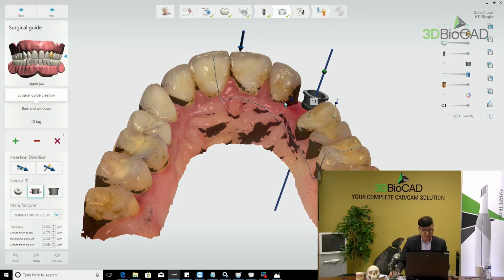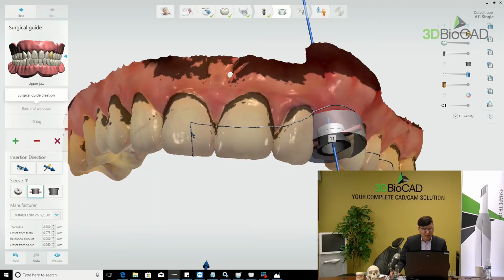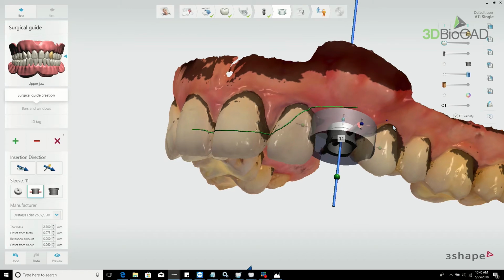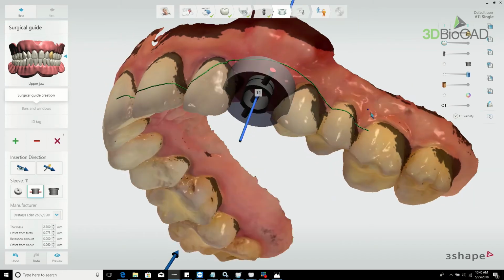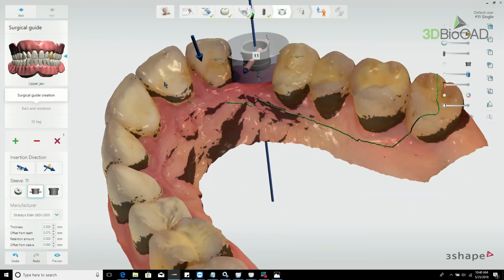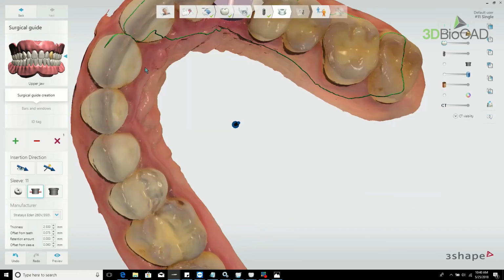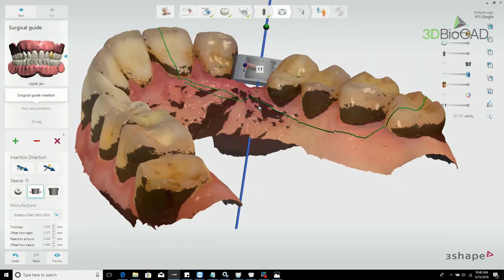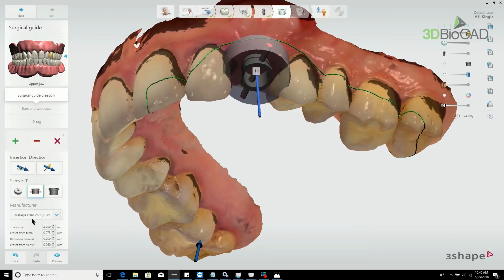And let me just delete that out. The guide design is like just draw the line, that's it. You can click it or draw it, both ways are fine. Click, click, click. First one, and anytime we can modify it. Okay. And preview, please. And then at this time, we can see all the manufacturer names here.